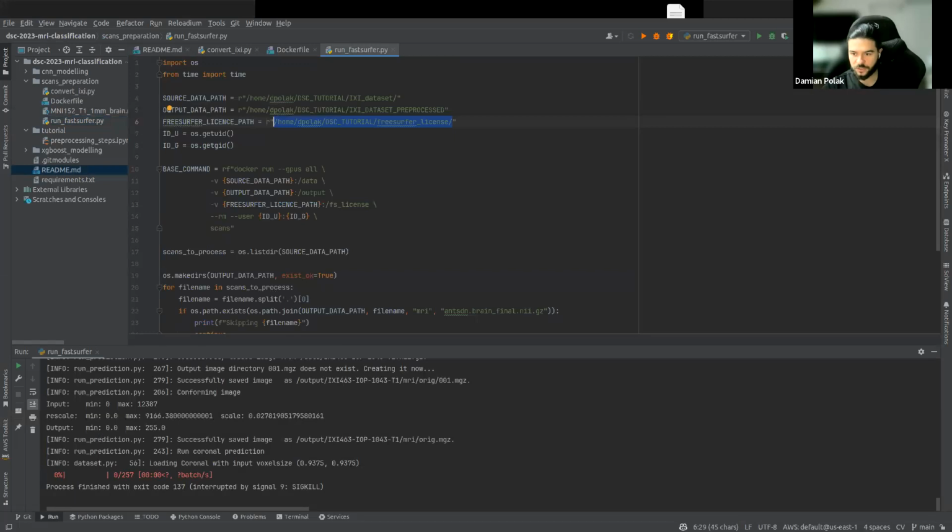After this, we can proceed with running the classification of these examples. First, we need to combine all the results into one large data frame with one scan or subject per row. I've prepared a parser in a module called xgboost_modeling, and the parser is called stats2csv.